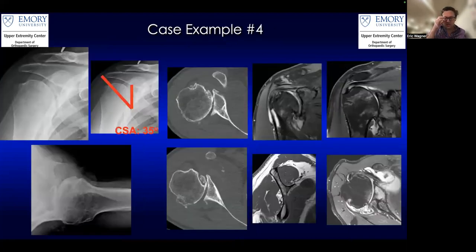Another example of a patient. So this is a patient with a pretty good rotator cuff, maybe partial thickness tears, but nothing that we worry too much about. Here's your biceps, but you can see in general, it just looks like a really bad joint. Some osteophytes, a goat's beard here, a goat's beard there, and you can see some posterior wear of the joint here.